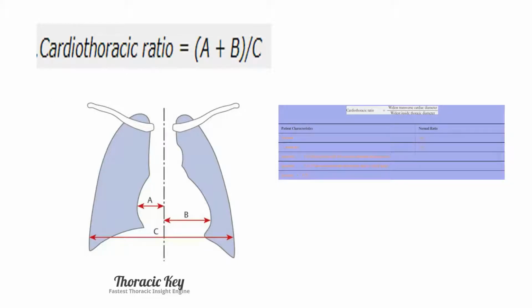Now, the sensitivity and specificity of cardiothoracic ratio. It is actually more specific than sensitive, and that means there are probably so many false negatives. So you can miss a large heart by doing this one. Specificity is reasonable, and that means the diagnostic confidence of cardiothoracic ratio, if it's big, is reliable. Okay, the total accuracy is 0.59.